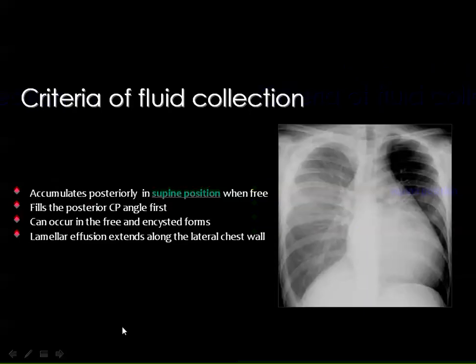And sometimes, especially in the pediatric age group, you got this appearance where you see that the lung field is veiled or looks like the ground glass appearance. And if you ask the technician, he may say that I radiographed this patient while being supine because I failed to put him in the erect position.